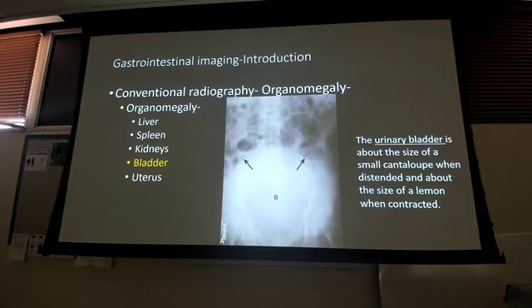Bladder, same concept. Which area of the bowel has the most air? Rectosigmoid. Normally sits right in here. Where is it? I don't have any. On top of that, look at my radio-opaque line. That is huge. What is going on there? So the urinary bladder is insane. It can expand to very large sizes. Size of a cantaloupe. A small cantaloupe, the urinary bladder can expand.